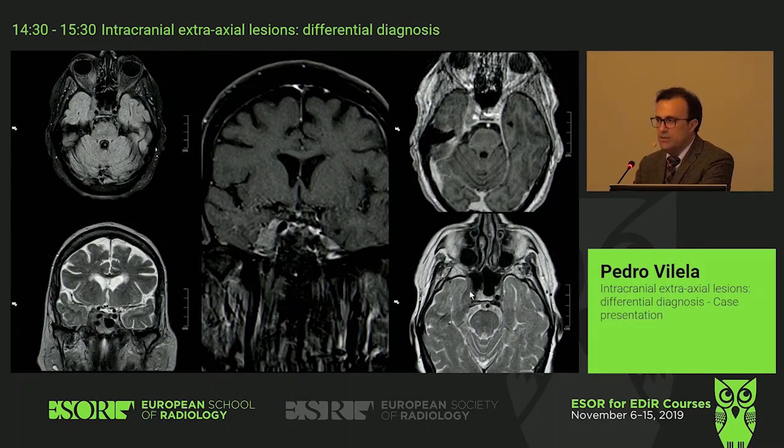Okay? Or perineural spreading of a carcinoma of the base, if it was a perineural spread, but we don't have anything else.